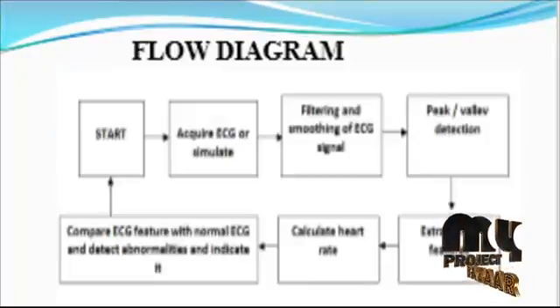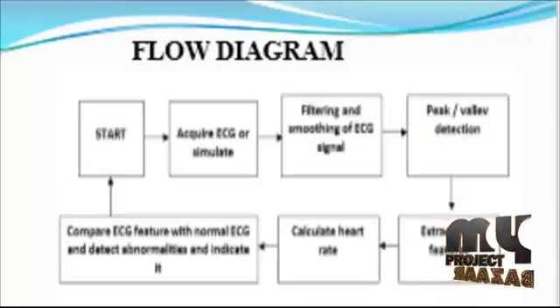Now we are going to discuss our product flow diagram. LabVIEW has been used to acquire the ECG data obtained from PhysioNet and display the raw ECG. After the data acquisition, the ECG waveform data are sent to the express virtual instrument for signal processing. This part of the process consists of digital filtering, digital smoothing, wavelet detrend, and wavelet denoise. The wavelet detrend and wavelet denoise are part of the advanced signal processing toolbox, which is very useful for ECG signal processing. The signal processing removes the noise and power interference white noise from the signal.